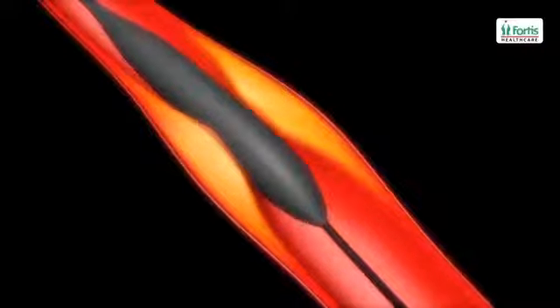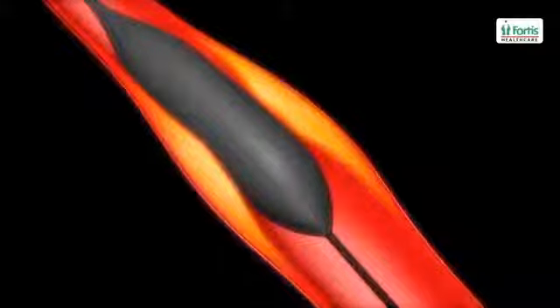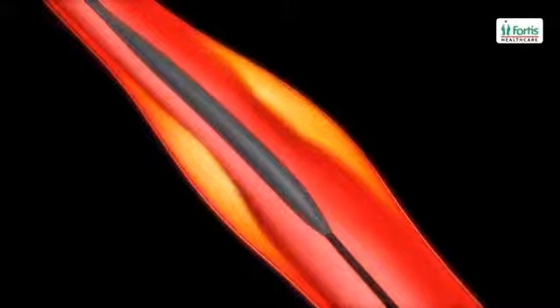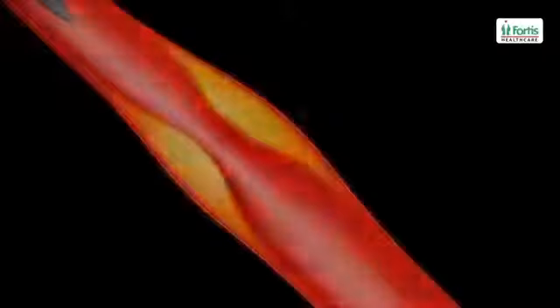Rapid inflation and deflation of the small balloon pushes the vessel wall out, re-establishing the flow of blood in the artery. After the blocked vessel is reopened, the deflated balloon catheter is withdrawn from the artery. The same treatment procedure is repeated in the case of multiple blockages.